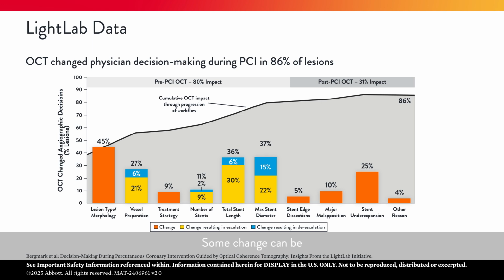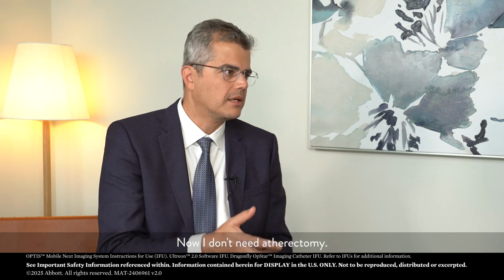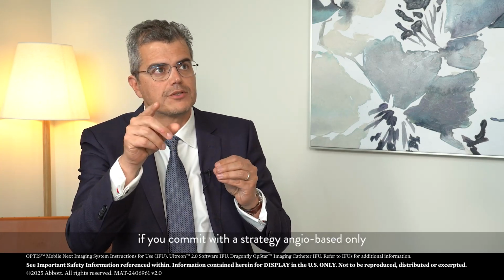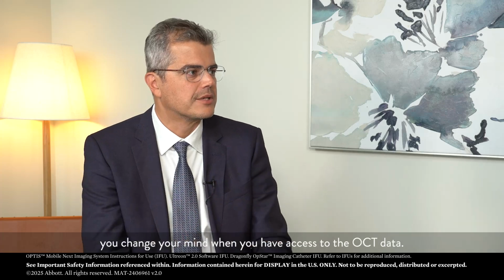Some change can be shorter stent, longer stent. Initially, I thought I needed to do atherectomy. Now, I don't need atherectomy. I thought that I could direct stent, but I actually need atherectomy. So all these questions precede the stent. And in 80% of the cases, if you commit with a strategy angio-based only, you change your mind when you have access to the OCT data.